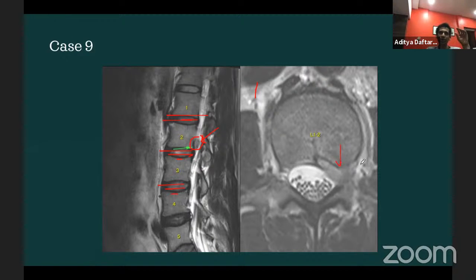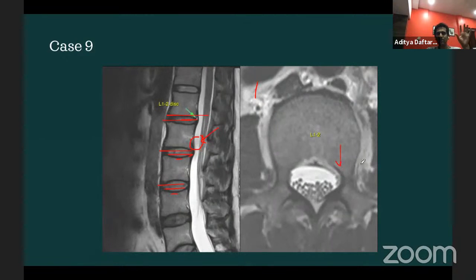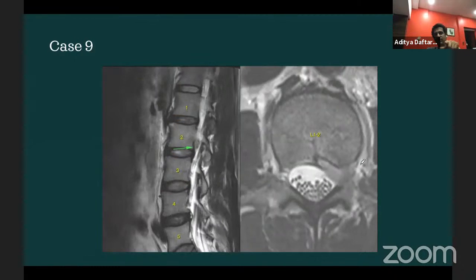This is particularly important in those cases where you look at the spine initially, it seems like, oh, everything is clear, it's a good spine, I don't know why this person has radiculopathy. You've got to look carefully for these little things on the parasagittal images. So this is giving you those few cases where you start to look at these cases from a standpoint of, I'm not seeing much on the scan, where else should I look?